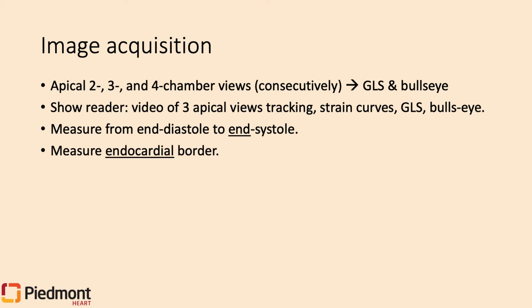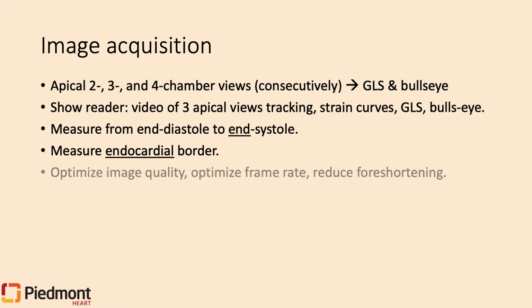Likewise, you can measure strain at either the endocardial border, the mid-cardium, or the epicardial border. Once again, for consistency's sake and to be consistent with our guidelines, we are recommending everyone measure strain at the endocardial border. It is also believed that longitudinal fibers are most present in the endocardium, and since this is longitudinal strain we're acquiring, it makes sense to focus on the endocardial border.